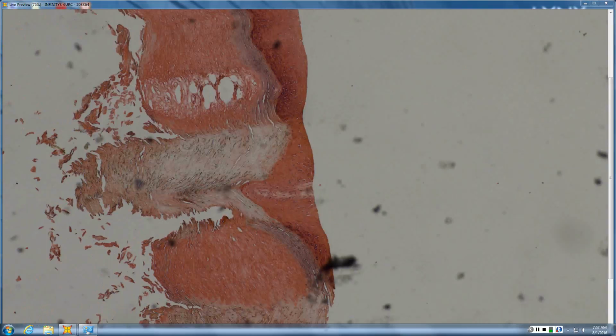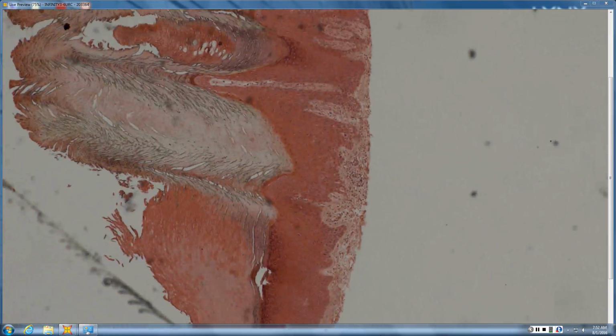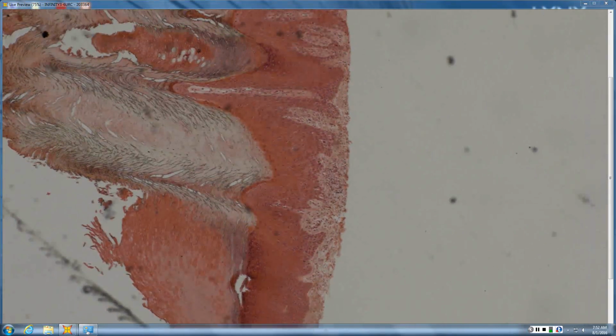Okay, Brian. Real thick horn. Looks like in areas you have ostial sparing. Kind of gives you that flag sign. In some areas you can definitely see that it relates to the acrosyringeal keratin. In areas it looks like the cells are a little bit jumbled, smaller.